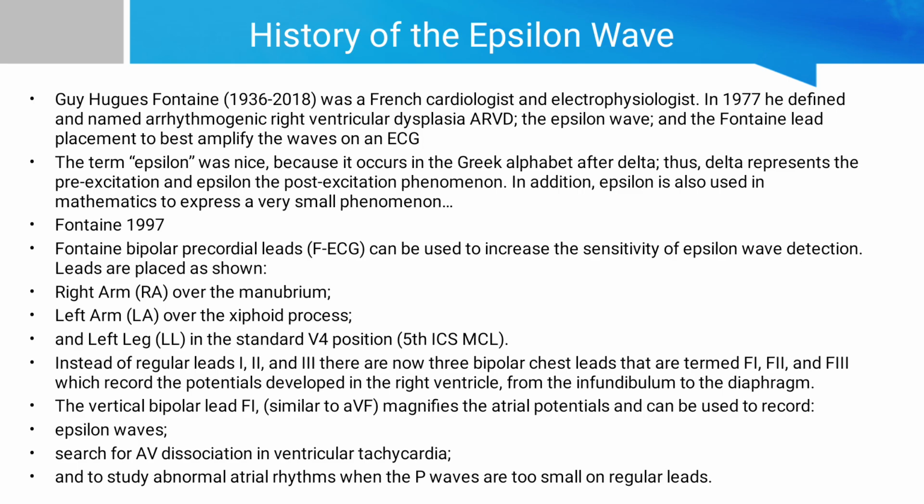Fontaine bipolar leads can be used to increase the sensitivity of the epsilon wave, as I have already discussed, and the leads are placed as shown in the figures.